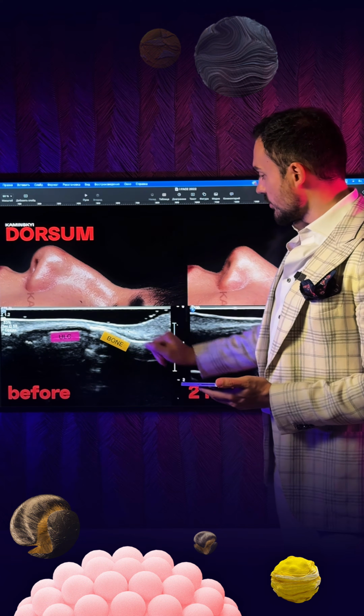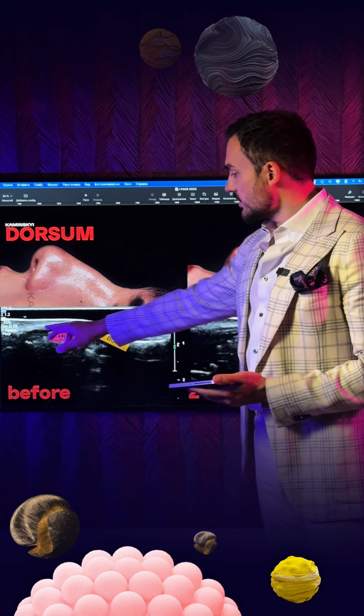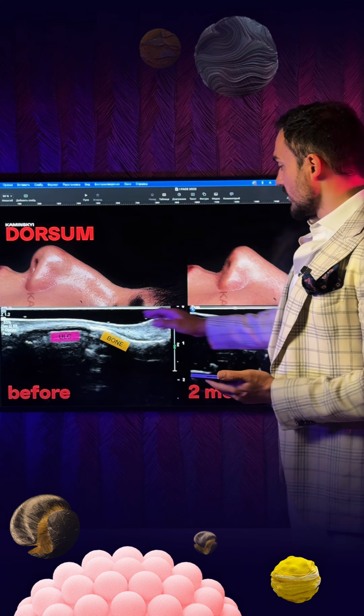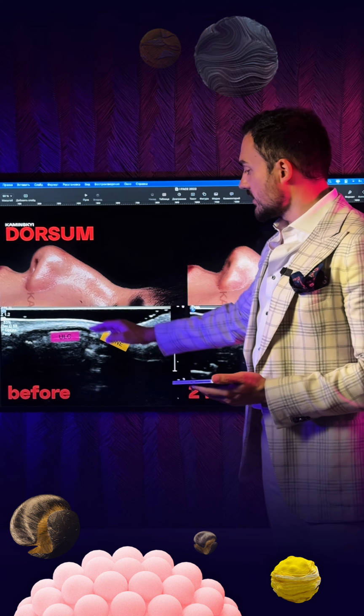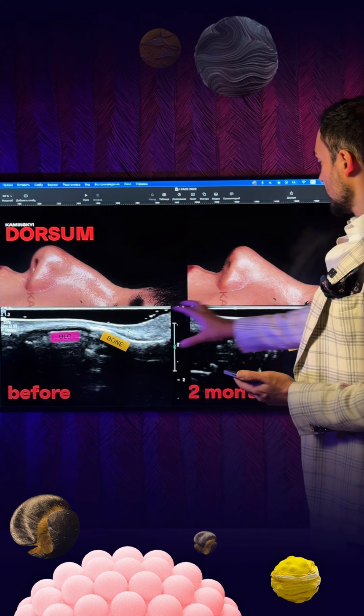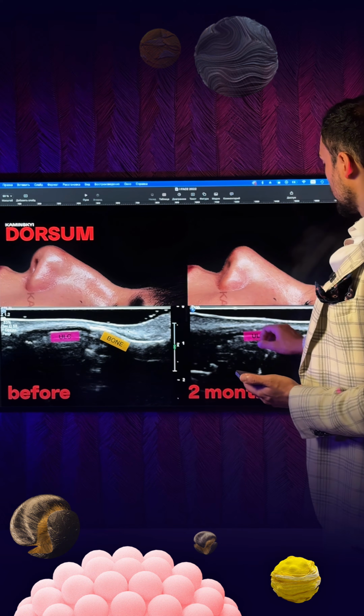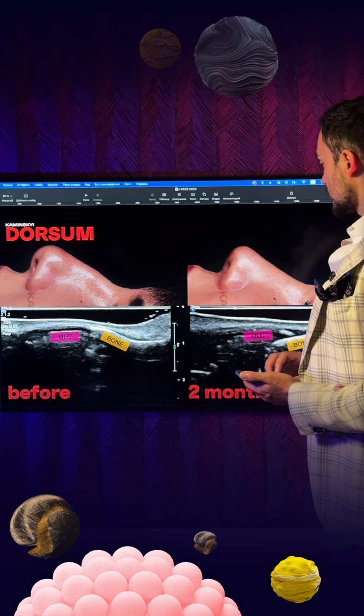Before, we saw the bone, the upper lateral cartilages, all the layers of the skin, the layers above the cartilages and the bone, and we can compare these two pictures before and after, with the position of the bone and the position of the cartilages.